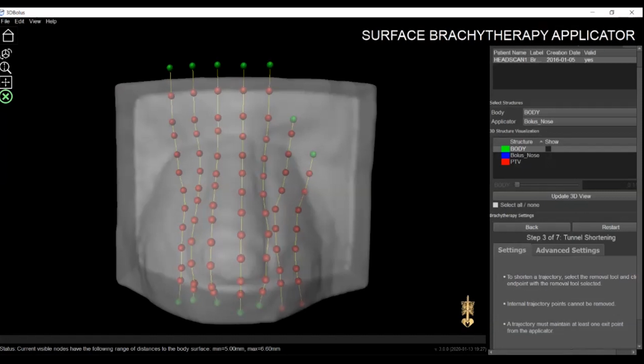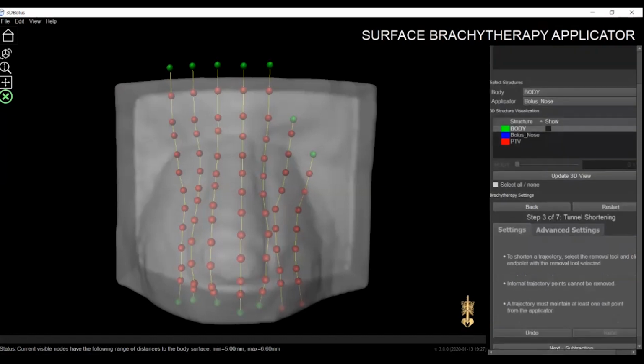And of course, within the new UI UX design, on the right-hand side panel, we can see short tooltips for any of the new features implemented, where users can quickly read what the feature is about and how to use it. And of course, our user manual contains all the detailed instructions on how to use all these features.